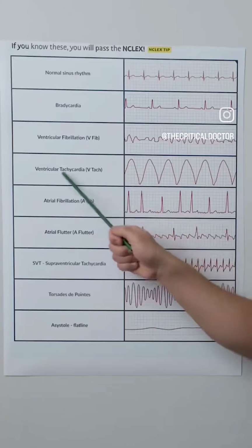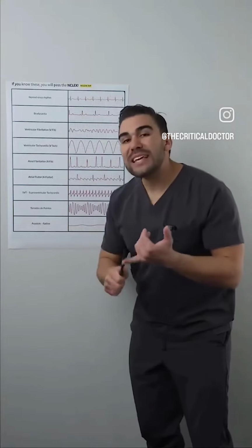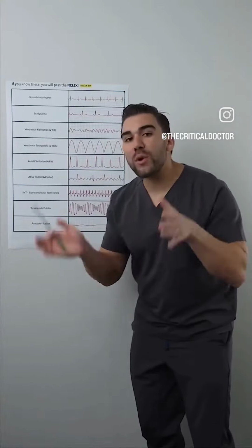Now VTach, or ventricular tachycardia, looks like a tombstone. And remember, you defib if you don't count a pulse, or you cardiovert if you can count a pulse.